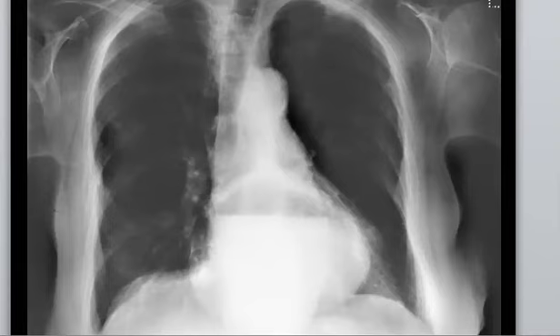So try to find the keywords as we do here, that when you see a picture or case, try just to mention the most important description, okay? So don't waste your time to write, for example, if the patient has colonic carcinoma and liver mets, and there is some incidental finding like degenerative changes in the spine, or maybe some bone islands. Okay, maybe if you have time, describe it later. But to be honest, most of the time you don't have it.